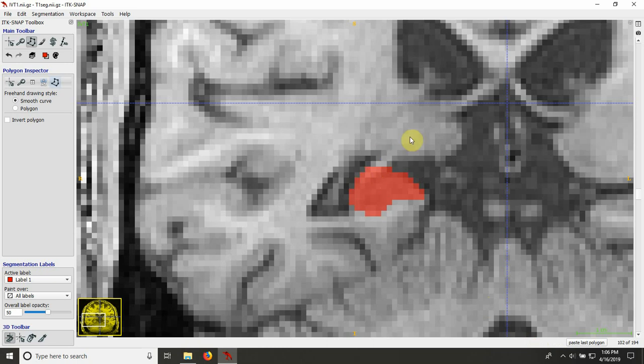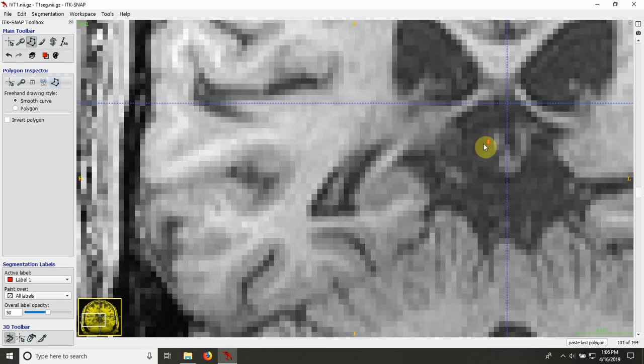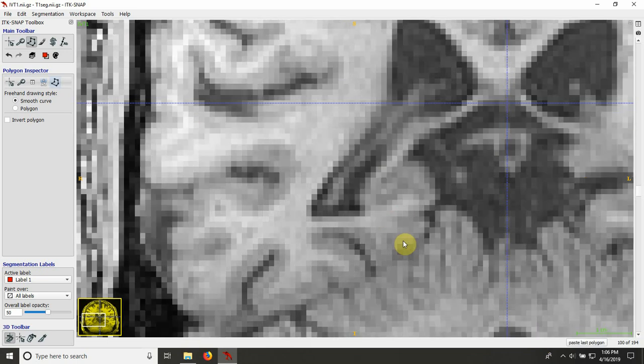What you're starting to see here is a white matter band, which is called the Fornix, and I would include just the portion of the Fornix that is adjacent to the gray matter, just like that. But I think, again, this might be a place where other protocols might be different. One thing that you can also see here is that the hippocampus is starting to have a bit of a different shape, which is also pretty common in the posterior portion of the hippocampus.